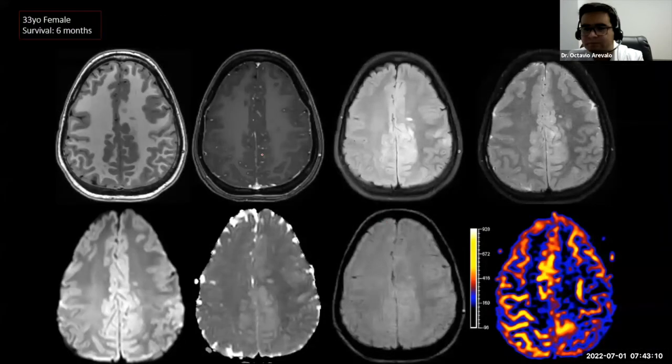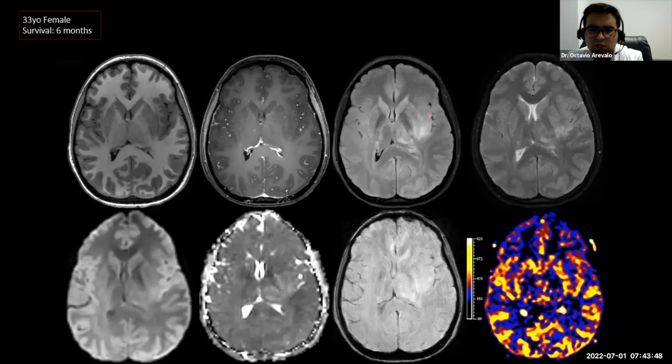This is a 33-year-old female patient. Again, I'm showing you these patients in the gray area. And this patient has this diffuse multicentric T2/FLAIR mass-like hyperintensity involving the left frontal, temporal, and parietal lobes, but there is no restricted diffusion, no enhancement, no hemorrhage or calcification. This is the perfusion without contrast, ASL, no increased perfusion that you can call. You would have read this as a low-grade glioma with a gliomatosis cerebri pattern of growth.